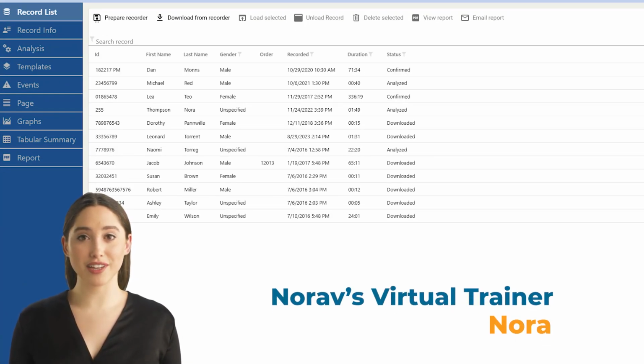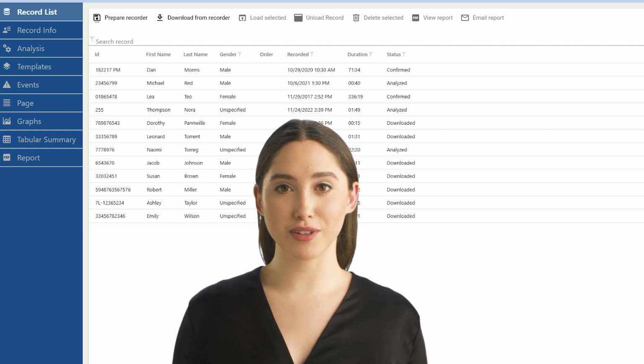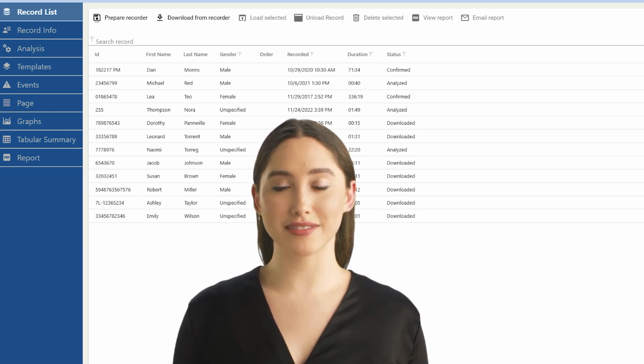Welcome to this tutorial video on the new NH301 Holter analysis software from NORAV Medical. NH301 is the latest version of NORAV's Holter analysis system. It features a brand new user interface and more advanced analysis capabilities. In this first video, we will provide an overview of the key features and navigation of the NH301 user interface. There will be a total of 3 tutorial videos diving deeper into using the software.